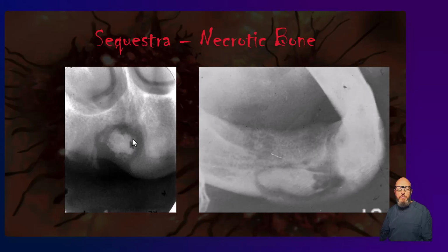And you saw this before in our Acute lecture, our radiopacities surrounded by radiolucencies. One of those was osteomyelitis sequestrum. And this does have a little bit of an irregular border. It does look well defined. But remember, osteomyelitis can look well defined if somewhat irregular. And this one, we also showed you before, another sequestrum. This one's below the canal, so you probably shouldn't even think odontogenic type of lesions.